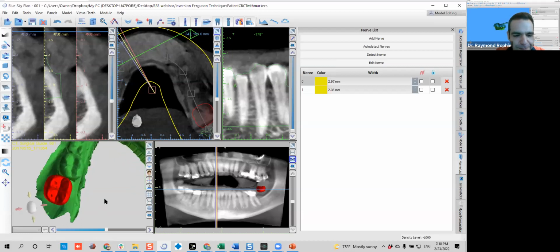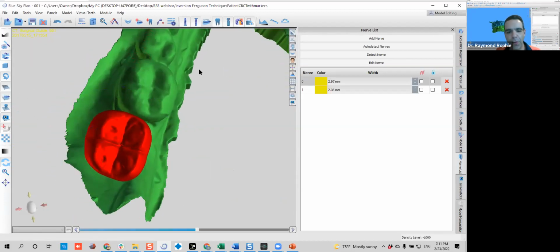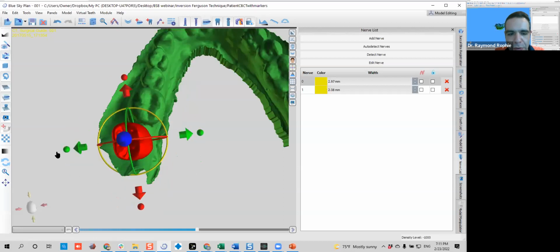So now we'll zoom in. I'm going to give you a workflow that works for me since I was doing all this as a lab. First of all, you can maximize your window, and you will always focus on a few positionings. So I have first occlusal. You can drag your teeth by dragging the tooth, or using the widget to rotate.